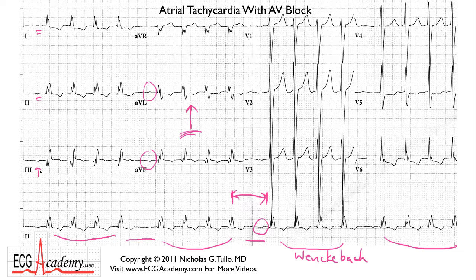It's not sinus. The trick is to try to figure out where the rest of the P waves are. If you scan in between, I hope you would notice that this very sharp deflection here, midway between the two beats, is the next P wave. And if you scan across, you see another one here, and then one that's even here.